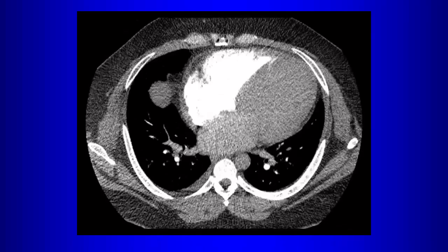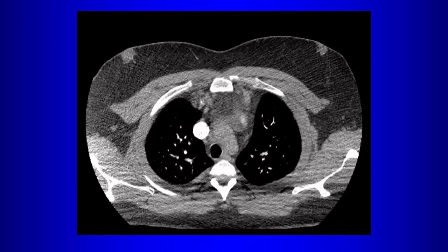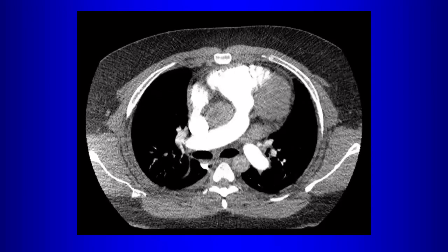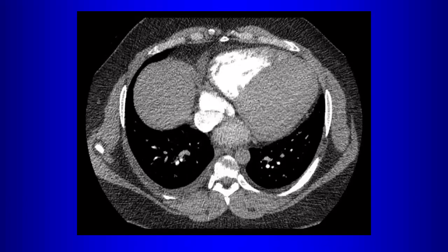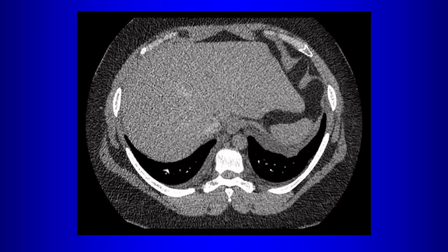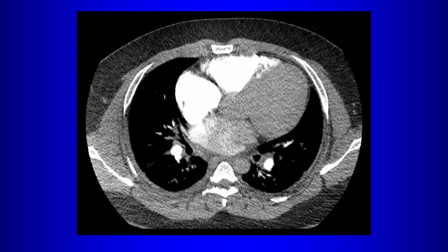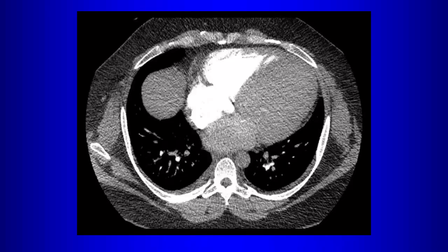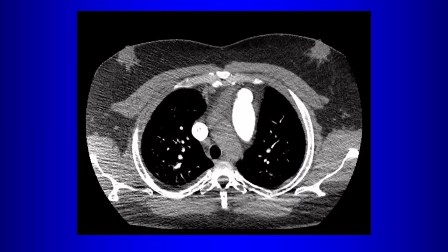Yes or no? All right, we don't see a PE. Are there any other comments you want to make? Signs of heart failure. So what are the signs of heart failure? The contrast going back to the liver. Like reflux of the contrast to the liver. So poor heart function. Well, not really that much.